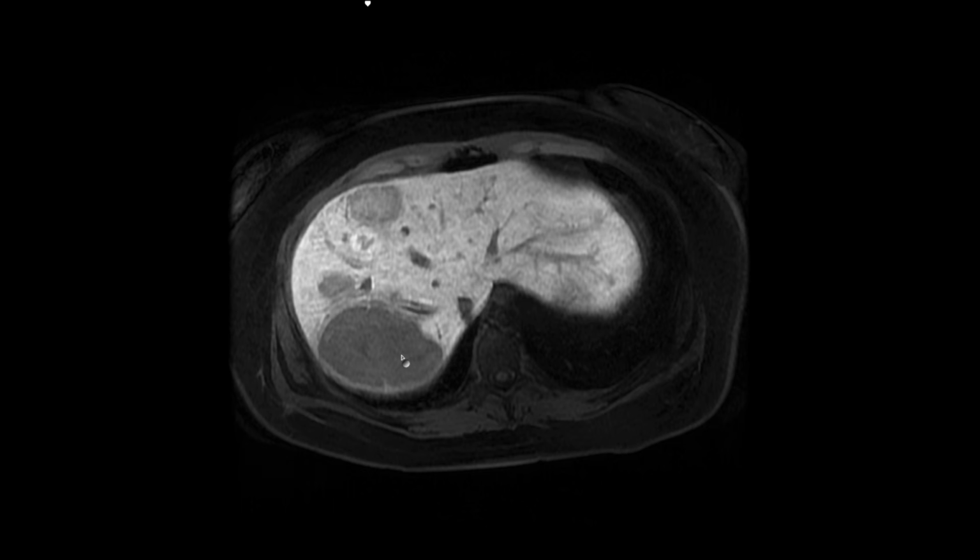If the patient especially is on oral contraceptive pills, which is a risk factor for these, they can stop the OCP and follow it up shortly and see if they reduce in size. But again, that's well beyond the scope of this talk. I just wanted to show you an example of one abnormal MRI and how we can look at all these sequences to try to determine what we're looking at.